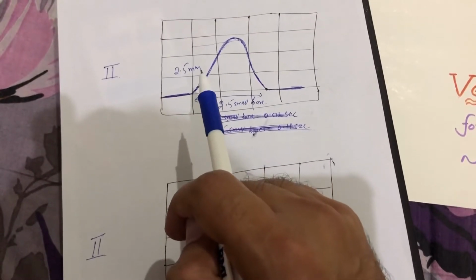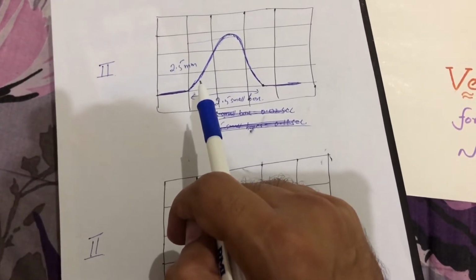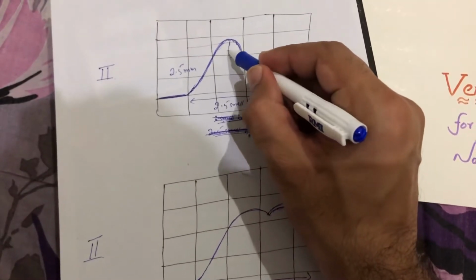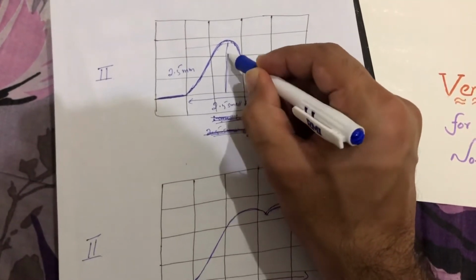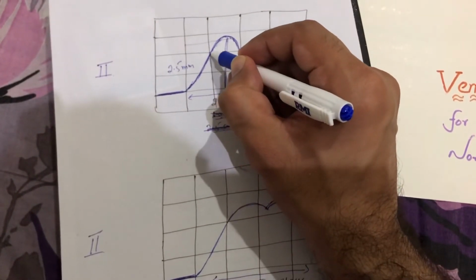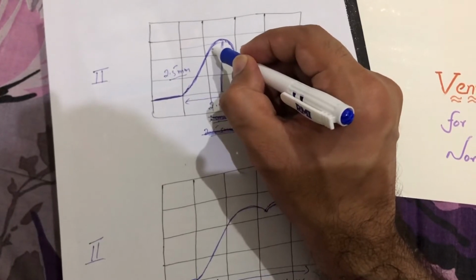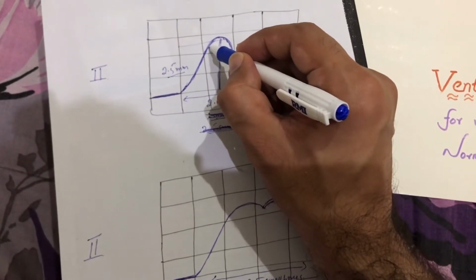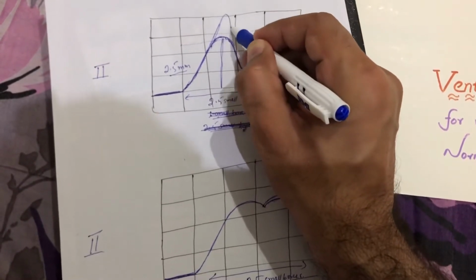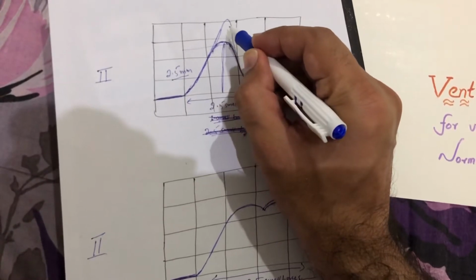And we also know that this first part of the P wave is going to show the depolarization of the right atrium. Remember that whenever right atrial hypertrophy occurs, this first part of the P wave is going to be increased more than the normal, which will be more than 2.5 mm or more than 2.5 small boxes. For example, it will be like this. It means that the atrium has been enlarged.